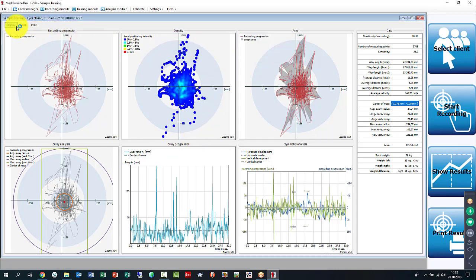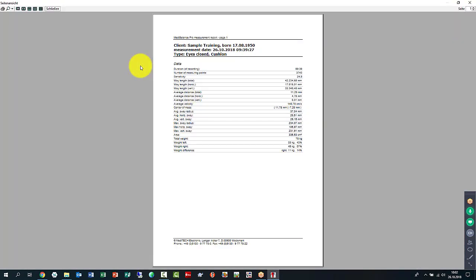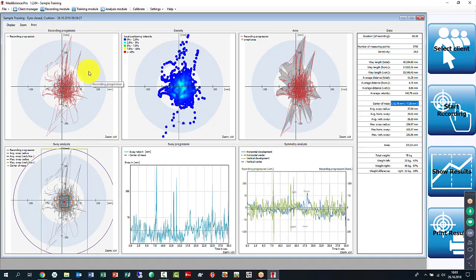And I could just put that on file, put this in my record, or I can do a preview here to show you better what the client actually gets to see, which is the numbers and the graphs. So everything that I have on here, I get as a full report for the client. That's what the system can do in terms of reporting. I can adjust the way it appears and have pretty good analytical functionality for the system in that scope.